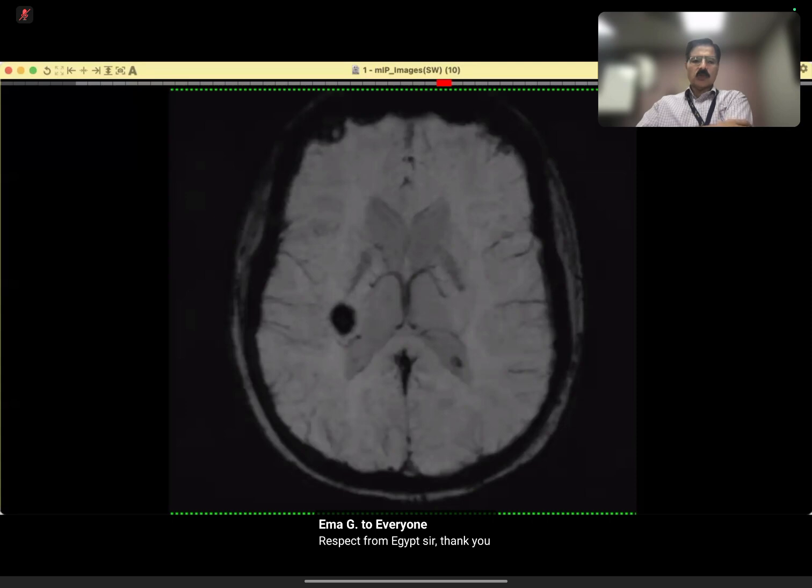Remember, I showed you a geode, I showed you a lytic, that epidermoid. So you have to really develop your skills. Remember the differential diagnosis, but develop your minds to be able to just tell the examiner the relevant differential diagnosis.